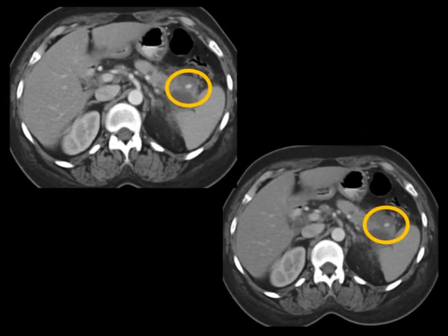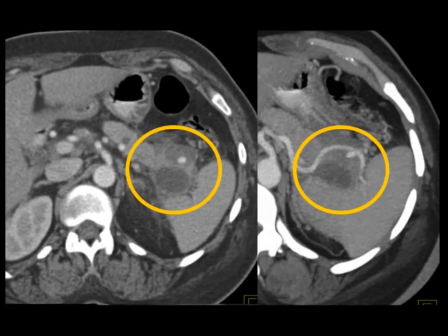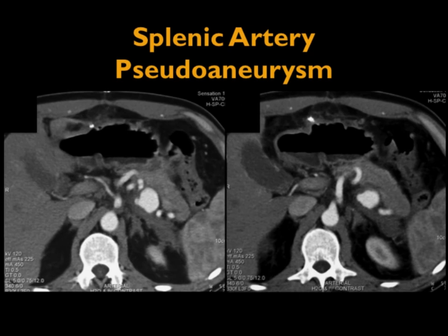Here is another few views of that patient's pseudoaneurysm here as well. These cases you can resect. Embolization is more common these days, and in 3D you really can show the vessel very nicely. Another example, splenic artery pseudoaneurysm. You can see this fluid around it.